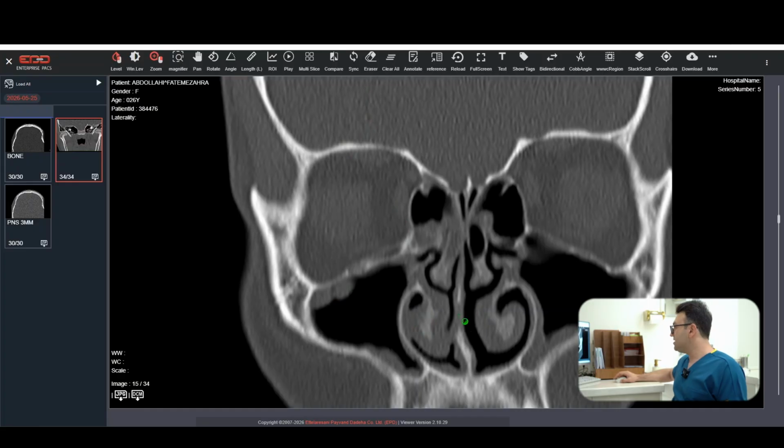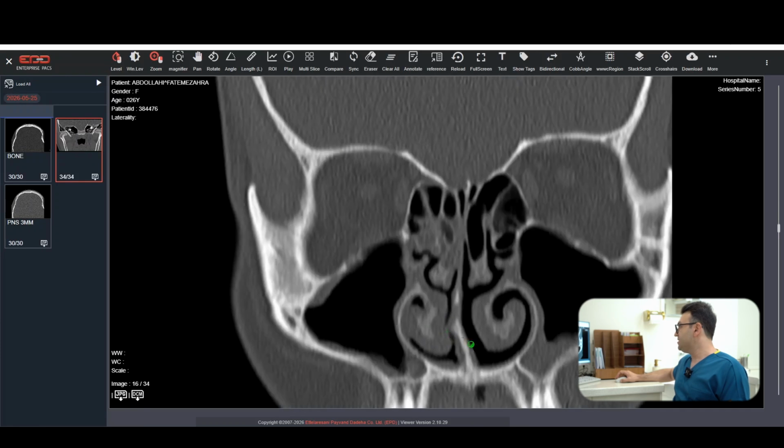After that, for the inferior turbinate, we seek for the synechia. It means the adhesion of the nasal septum to the inferior turbinate. I see the synechia there. So that is another sign of why my patient can't breathe very well and has problems, especially during sleep. Sleep apnea sometimes happens because of the nose obstruction.